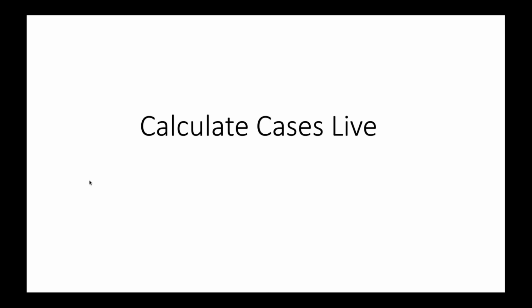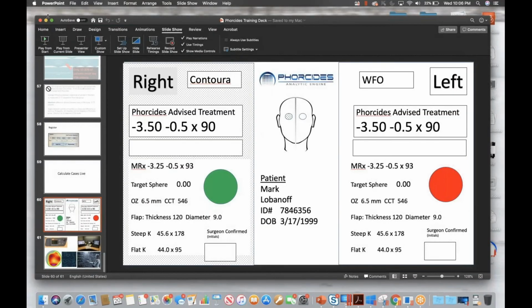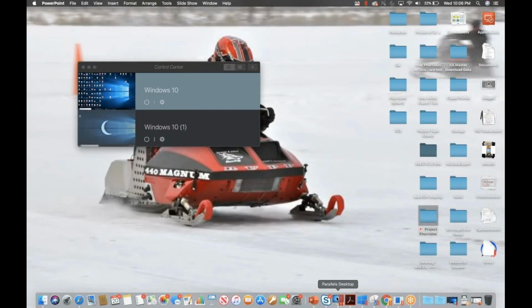And now we're going to kind of switch gears. We're actually going to calculate some cases. I'll show you how the software works. So let's switch over.